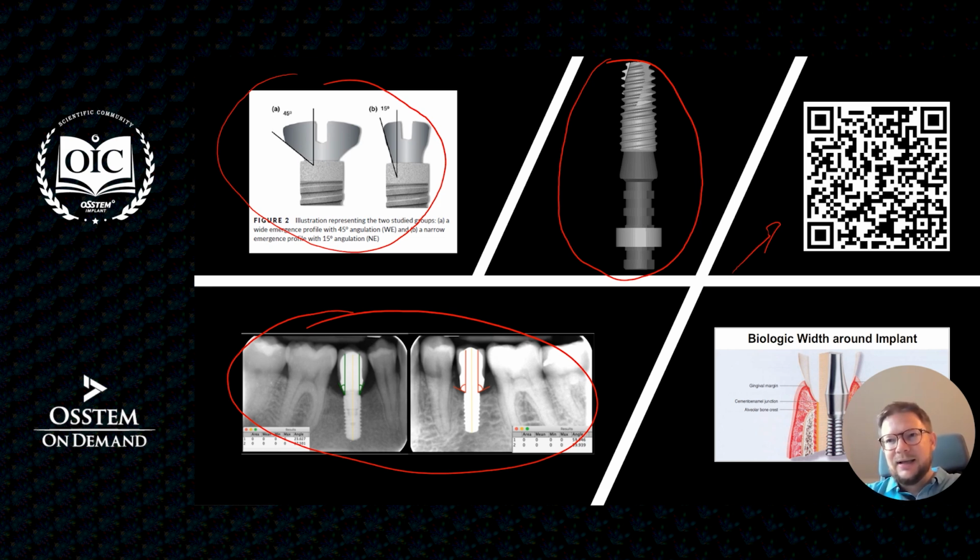And if you download that file and import it into the software, you can download it from the website. You can plan your implant case based on the very well developed library within that software, quite automatically, because if you select just the position in the oral cavity, the preset will provide you the appropriate size of the implant connected with the appropriate healing abutment, or multi-unit abutment, or temporary abutment for restoration.